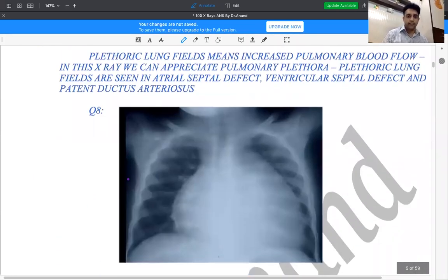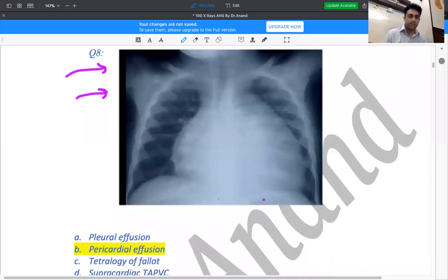Okay, what is this? Any idea? What did you write for this question? What is this? Any random guesses? So what is this? It's nothing but a case of, any idea what it is? Yeah, very good. So Rimsha has come with a very wonderful answer.